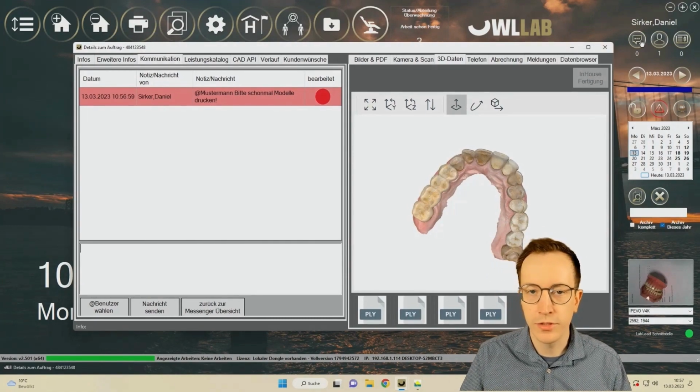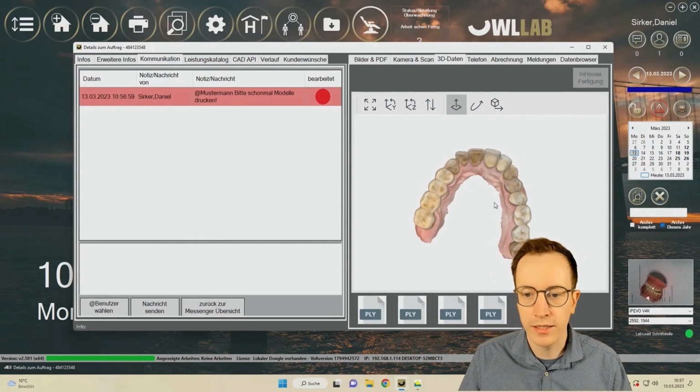He will then observe it here in the upper right corner that he has a task, and when he has handled the case, he can subsequently set the entire thing to processed.